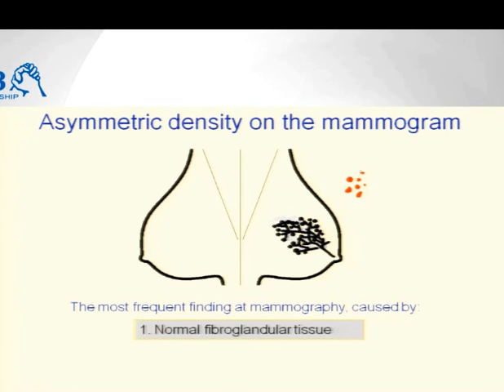We can see it separated from the other because there is fat. So that is number 1. Number 2 basic building block, if we are lucky, is the ducts and their branches, and here is a duct and branch, and they are also separated by fat.